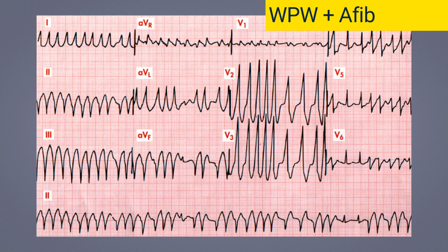The rhythm is consistent with atrial fibrillation due to its irregularity. Patients with ventricular pre-excitation syndrome often have a higher predisposition to develop atrial fibrillation. Most times, treating the accessory pathway and managing the WPW syndrome with ablation can almost entirely eliminate the atrial fibrillation.